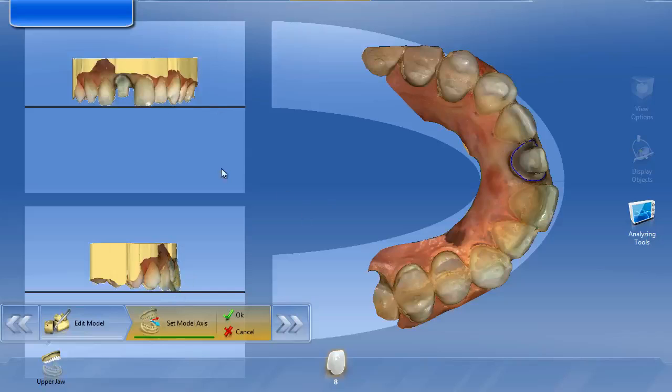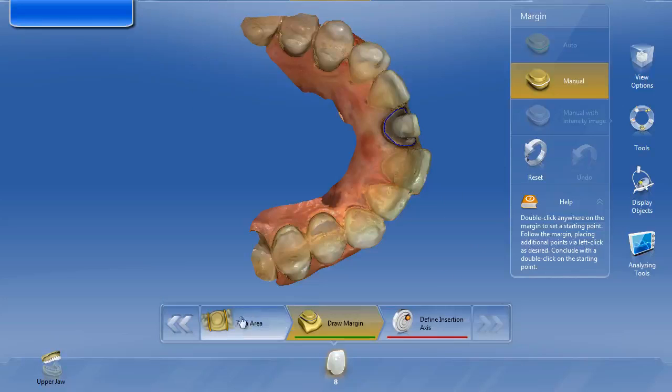So when I align this, I'm just going off the central incisors, getting these three pictures lined up. The one I'm concerned about the least is the one here on the right. This is just to get the left-right axis good for this picture. Again, I want to point out you can't see any of the margins here, but that doesn't really matter to me too much. So we'll hit OK, and we'll move on to the next step.